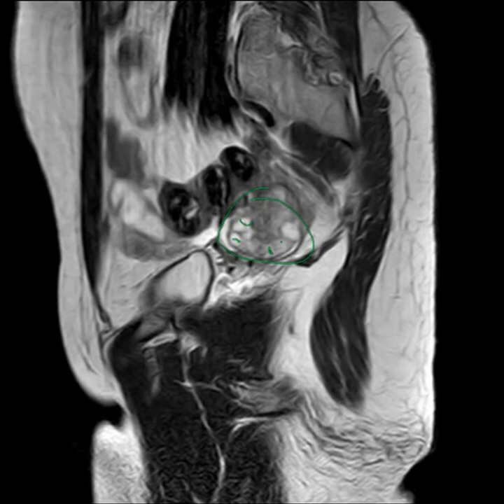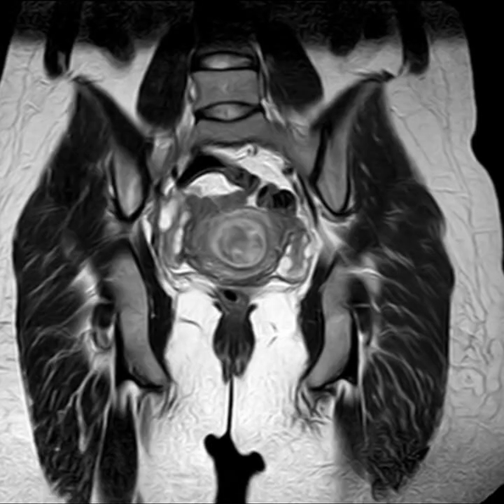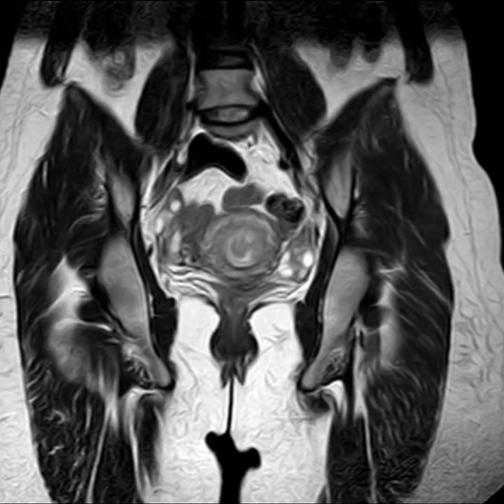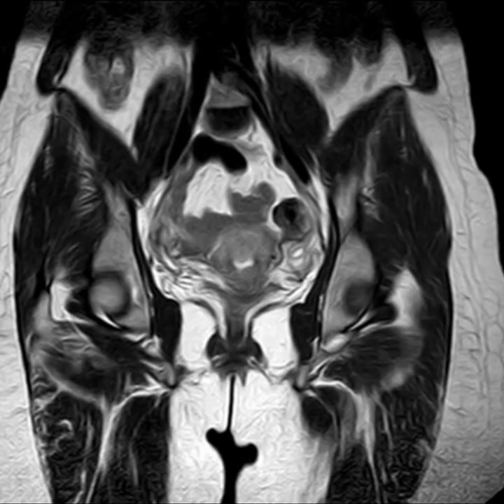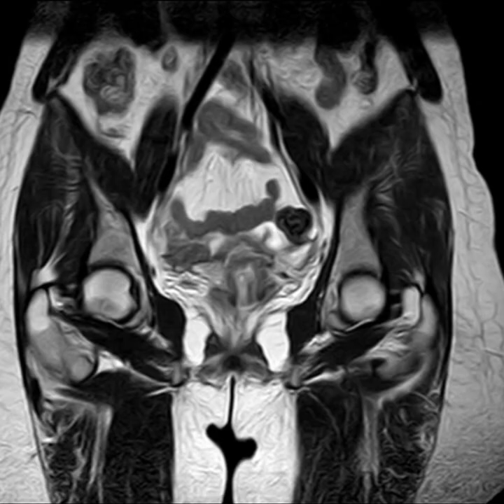Excellent job. So what do we do next? I want to see the rest of the images. Let's go for coronal T2 weighted images. Okay, so these are the coronal T2 weighted images, and we can clearly see the bilateral polycystic ovaries, and we can see that big endometrial lesion prolapsing from the fundal part of the endometrium into the uterine cavity, reaching almost to the level of the cervix, right around here.